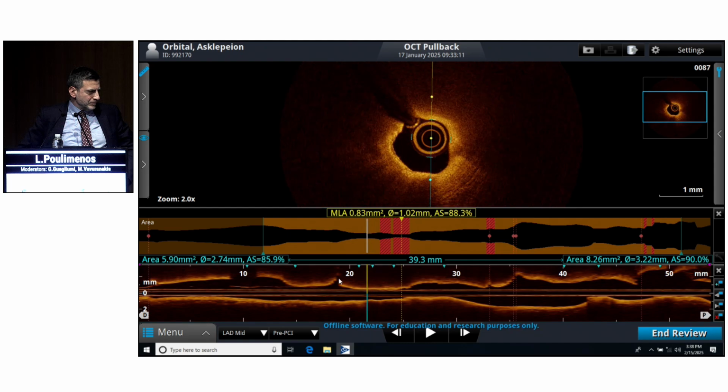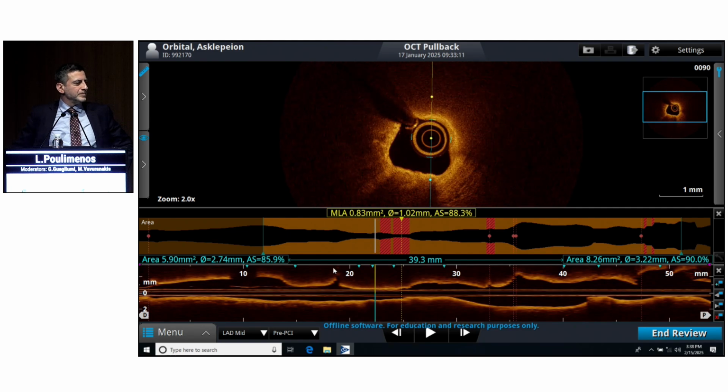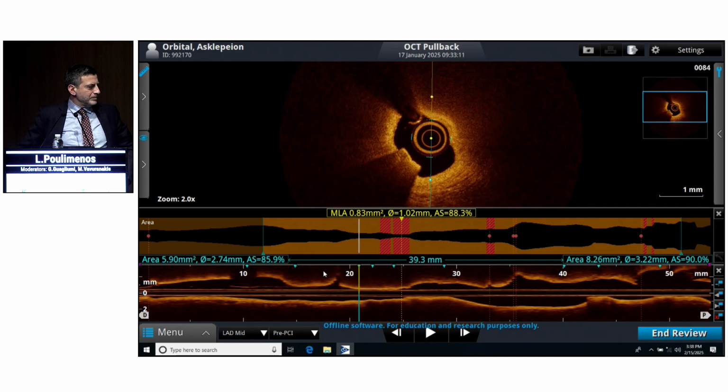And that is, I would say, not a very smooth surface. Then we are moving on. Could we characterize that as a calcific nodule? Well, if you say calcified nodule, there are two things. There is some calcific protrusion inside. You can see it is very asymmetric. Very important is that the remaining three quarters of the vessel are full of pathology. You cannot see the EL anymore. You cannot see the media. It means that, except this small segment, you have a huge fibrotic and fibrolipidic plaque.